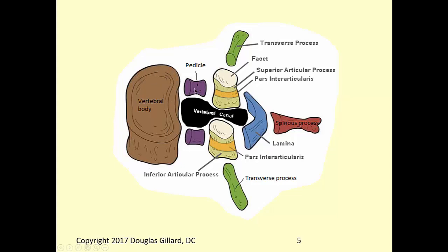So the vertebral body is connected to the posterior arch by these, the strongest piece of the vertebra. Pedicles. Next we have a column of bone called the articular pillar, collectively. Articular pillar is made up of two parts. Superior articular process, inferior articular process. Where they meet is the weakest part of the vertebrae. Good. Pars interarticularis. You can read. That should ring a bell.